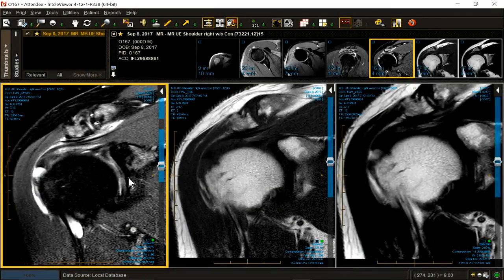So you've had challenging cases with areas of ill-defined signal and weird tears like reverse pasta lesions and CIDs and articular-sided tears. Here's just a straightforward one with a big, fat, thick acromion and a big, thick CAL pressing on the subacromial arch, an impinger.